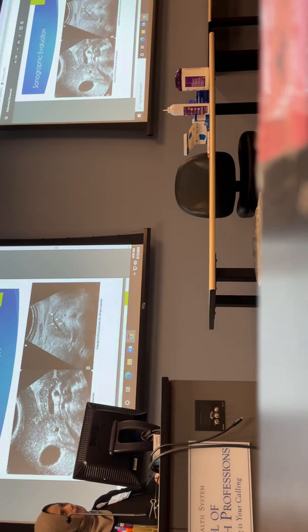Versus the image right here, this is a vascular structure because there is no pancreatic tissue over here. You can clearly see this is really bright and echogenic, right? That's not pancreatic tissue. You have pancreatic tissue here, but that's the uncinate process and it stops right there. So this is clearly a vascular structure. However, this tubular anechoic structure right here, that is the duct. Because you can clearly see we have tissue above and tissue below it. Everybody okay with that one?